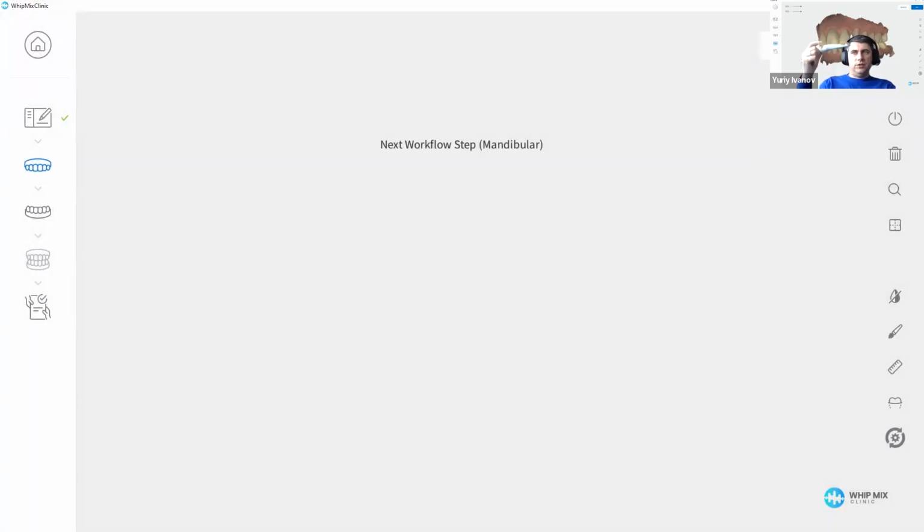So I have my scanner here. It looks like this, and I have the tip. The tip is removable, so I could take away the tip, and I could rotate this tip to have the mirror up for the upper jaw, or push the bottom button to rotate it to the mirror down for the lower jaw.